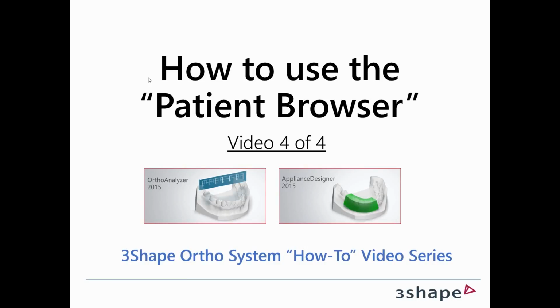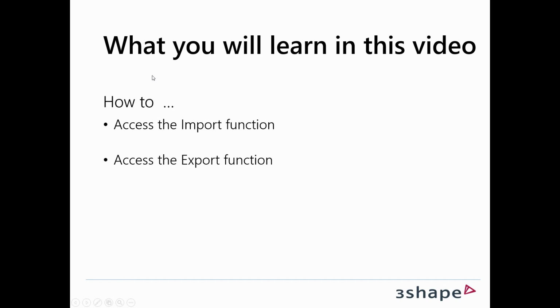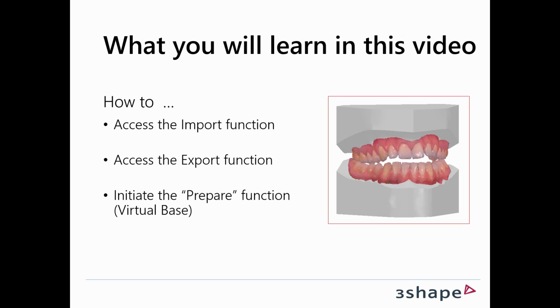Welcome to the fourth and final video on how to use the patient browser in the 3Shape Ortho system. In this video you'll learn how to access the import and export function, and also how to initiate the prepare function, allowing you to do a virtual base like I have on the picture here.